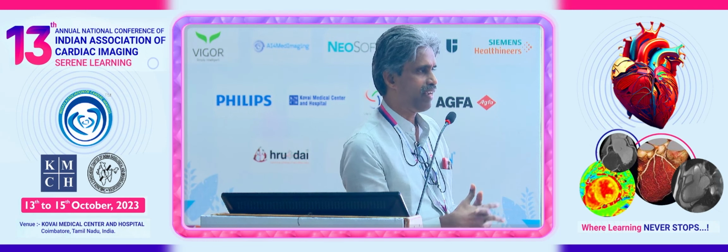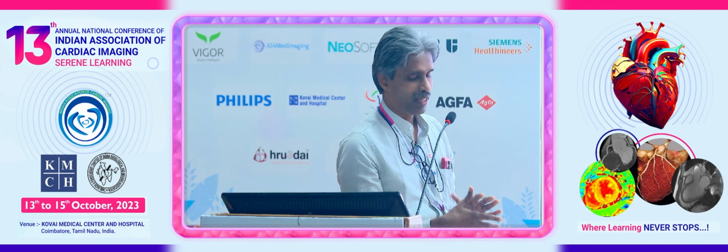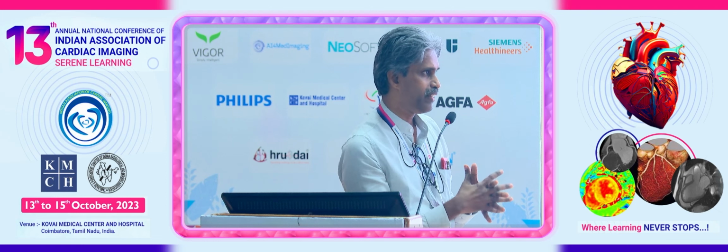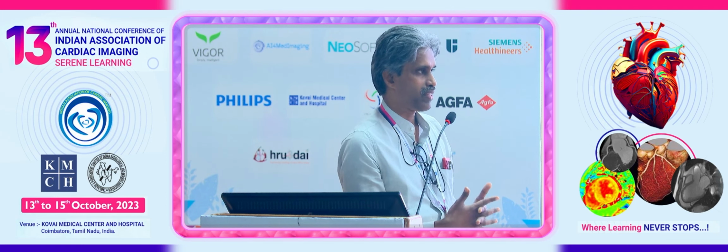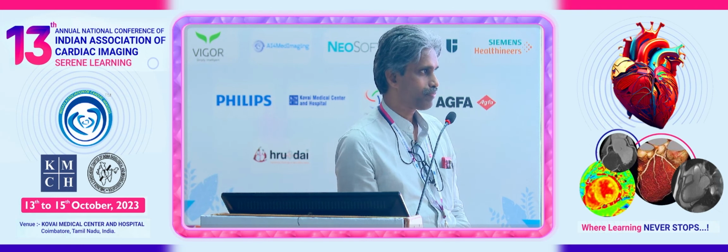In general, we'll take 15% as the cutoff, and we have software where you can quantify the total myocardial mass as well as the scar burden, and we can accurately say what percentage of myocardium is scarred.